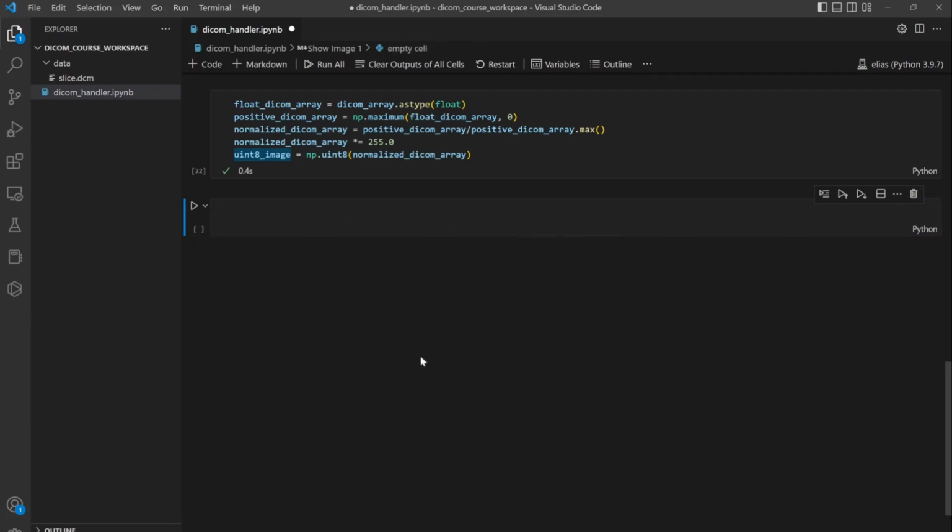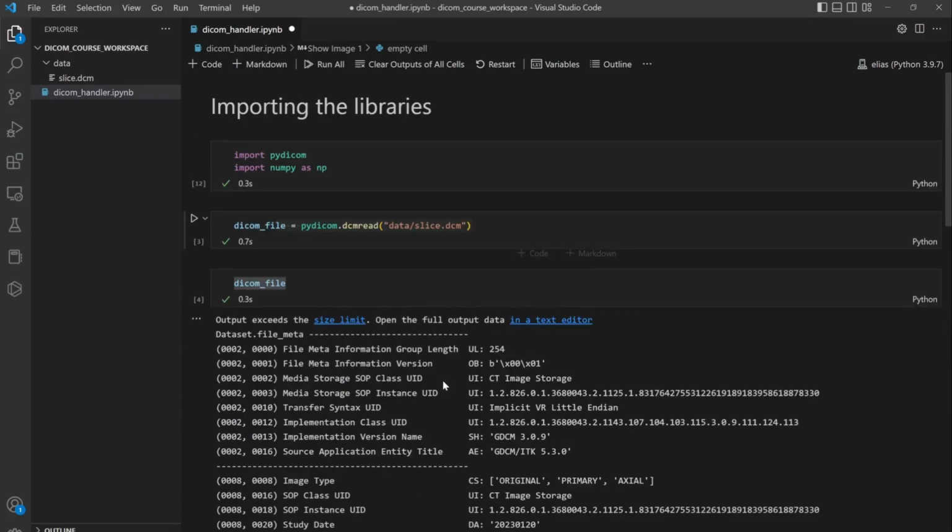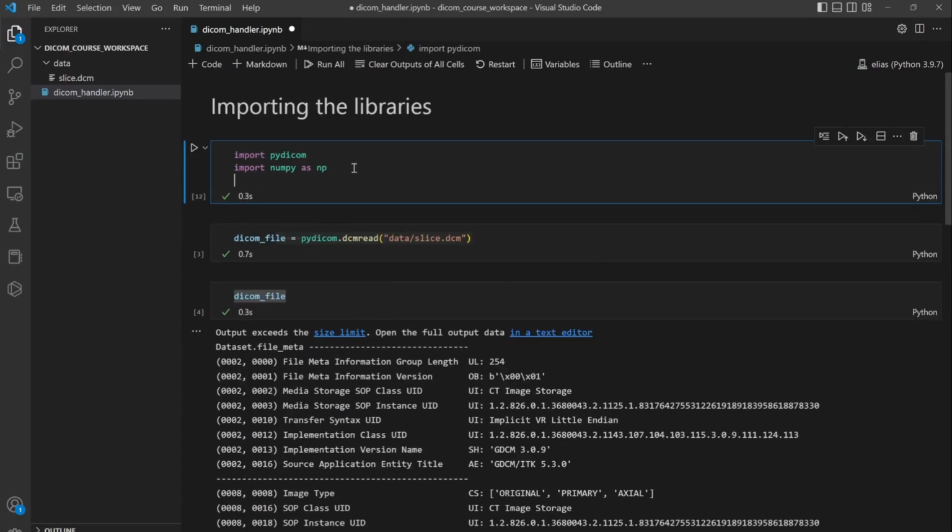But to do that, we are going to need the help of the Pillow library that we installed. Before that, we need to import it. There is a class called Image inside Pillow. So we can import it like from PIL.